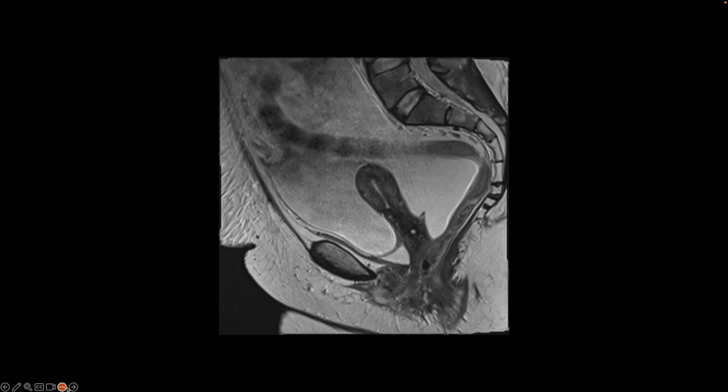Okay, single sagittal view from a female pelvis, and this patient has ascites, so there is a lot of free fluid anterior to the uterus, posterior to the uterus. Here is the endometrium that appears normal. This is a C-section scar seen in the lower anterior segment of the uterus, a Nabothian cyst in the cervix. This is the rectum and the anal canal. And so there is no abnormal finding here other than the ascites.